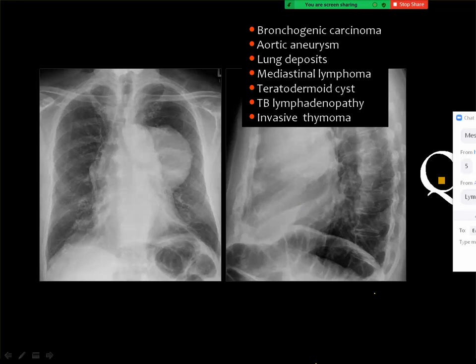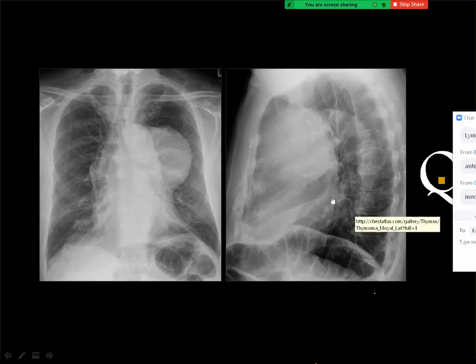Yeah. Also the possibility of lymphoma, maybe, but I encourage you to diagnose bronchogenic carcinoma, which is the common pulmonary lesion. But if you feel that this lesion is not a lung pathology, and Sarah is giving some of the right answer, that this is not a lung mass, it's a mediastinal mass, because in the lateral view it's projected anteriorly.